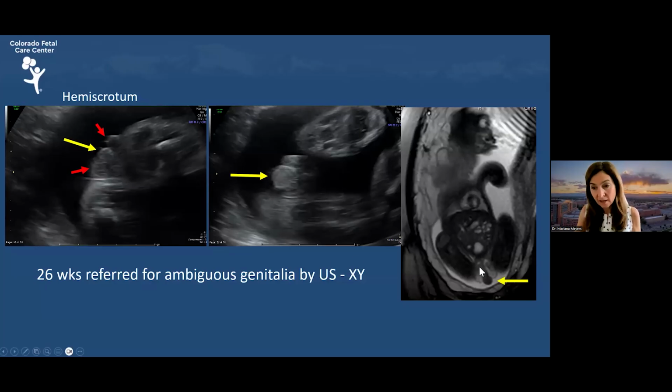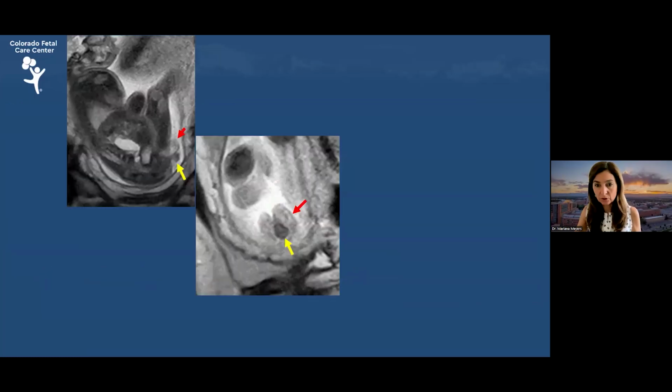Okay, that's a very normal appearance of the phallus. But in the coronal view in the MRI, what I'm seeing is, you have obviously the abdomen, one leg, the other leg, the 2 scrotal sacs, you can even see a hint of the testicles, and you have the phallus that is in between the 2 hemiscrotums and is actually heading south. That is the opposite to the line I showed you for the normals. That is abnormal. In the sagittal view, you have the spine, the butt of the baby, the thigh, the knee, the scrotum on top, and the phallus is underneath and is again heading south, not in a good direction. And in a close-up of the coronal view, you have again the hemiscrotums and the phallus in the middle.